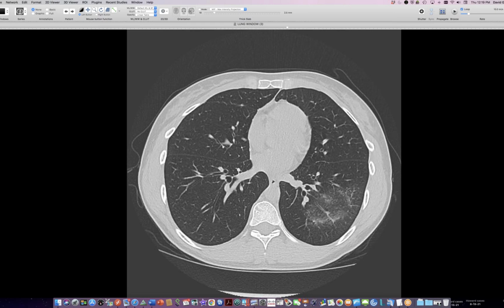So that kind of circularity here looks like those crop things that used to show up. Those, what do they call those, crop circles or something like that, that were attributed to UFOs or something. Yep. So maybe UFO activity in the lung there.